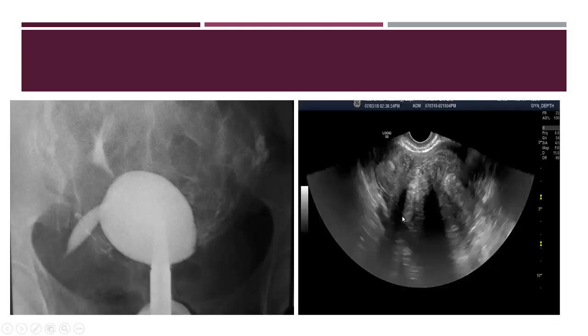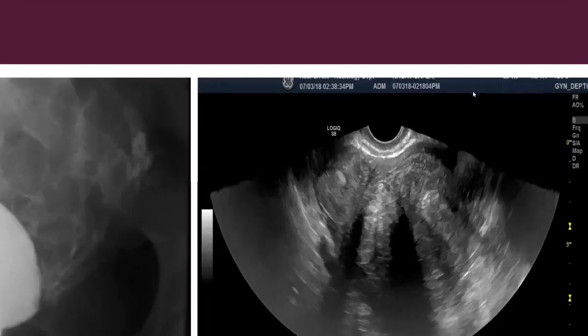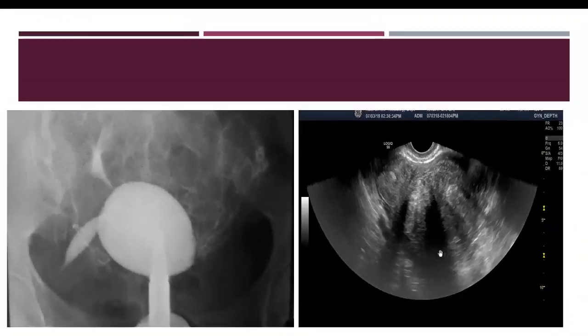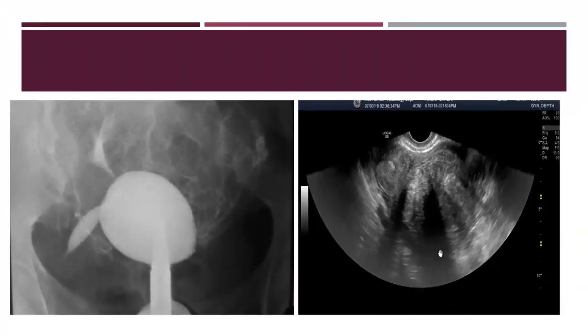On ultrasound, there is a very large posterior cervical lip fibroid, interstitial to subserous in location, and you note here it is stretching the cavity over it. It is stretching the cavity over, and this is the anterior lip of the cervix. So the contrast appears as if it is spread over the fibroid, so it appears with this appearance.